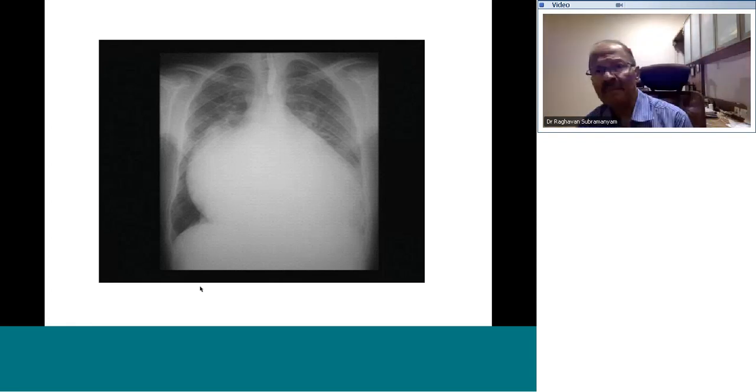Right. Quick comments on that X-ray. We've got to wind up in a few minutes. Yes, any takers?